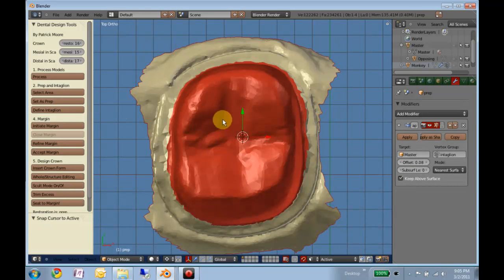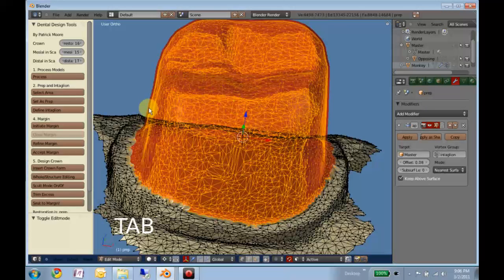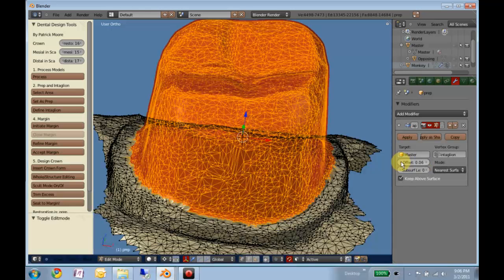Alright, now what this does is it adds a cement gap to the area of the crown that's not right here by the margin. So we want to leave this kind of 1 to 3/4 millimeter untouched zone, because that will make that such that it seals down onto the margin, with no space, and then we'll add a cement gap. And if we go back into edit mode, you can see the cement gap, which we can edit here in this modifiers. Later I'll make this is the actual parameter right here. Later I'll get that over here in a more obvious place, but right now this is 80 microns. Shrink it down or increase it based on the smoothness.